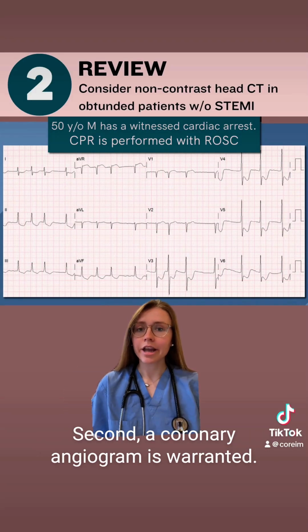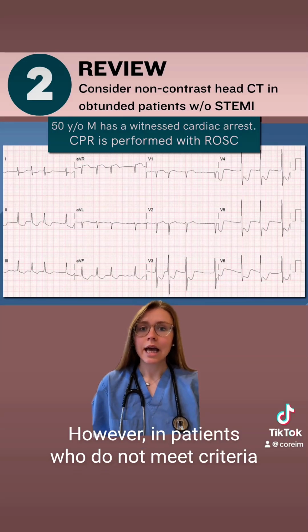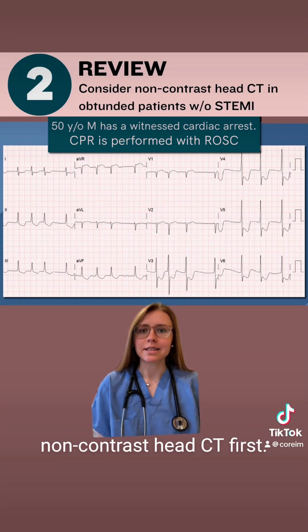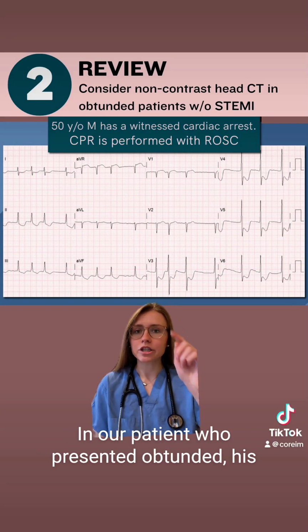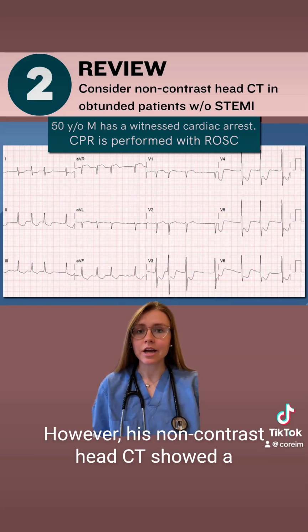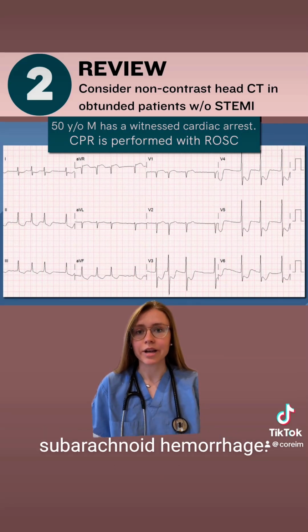Second, a coronary angiogram is warranted. However, in patients who do not meet criteria for a STEMI and who are obtunded, consider non-contrast head CT first. In our patient who presented obtunded, his coronary angiogram did not identify any occlusions. However, his non-contrast head CT showed a subarachnoid hemorrhage.